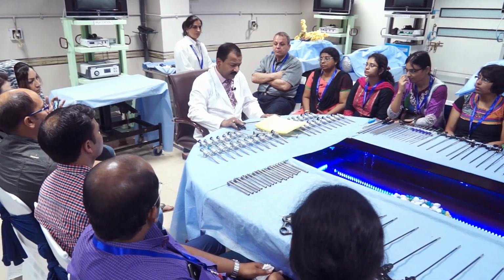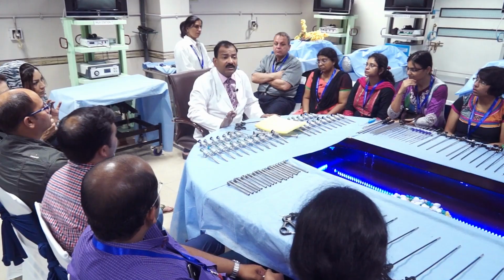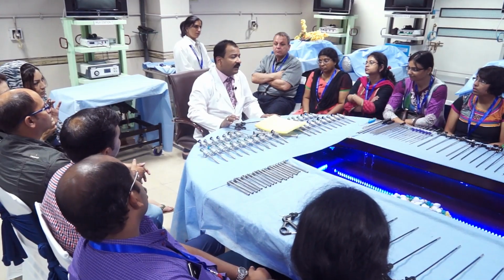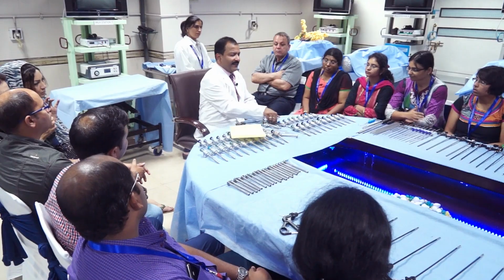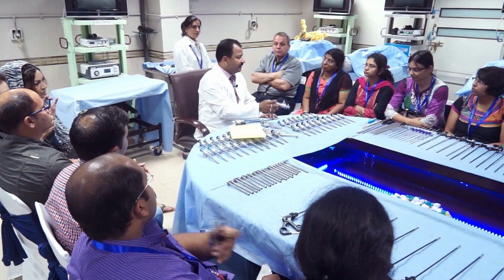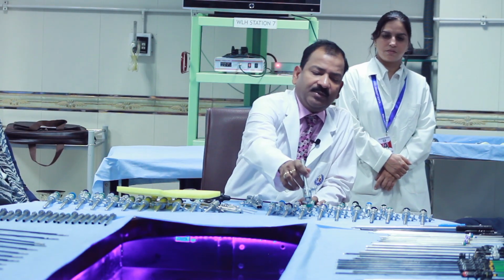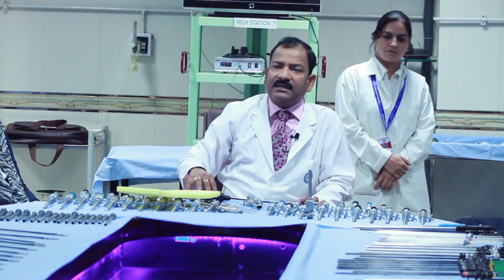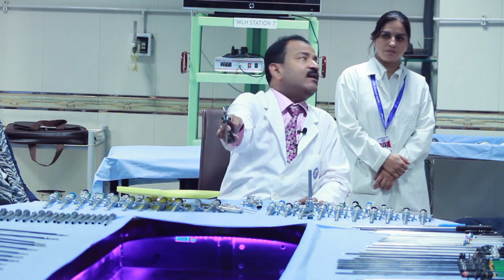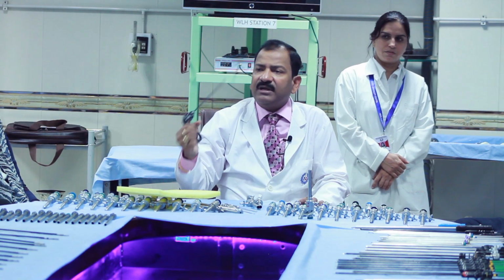This is just an example of how important ergonomics is. Another is coaxial alignment. Coaxial alignment means the eye of the surgeon, the target of dissection, and the center of the monitor should be in the same axis. Suppose this is the appendix. This is the head of the patient, this is the foot of the patient, and you are the surgeon.